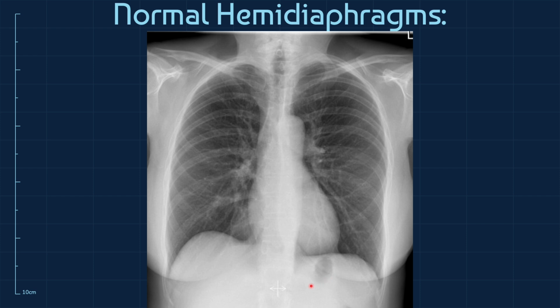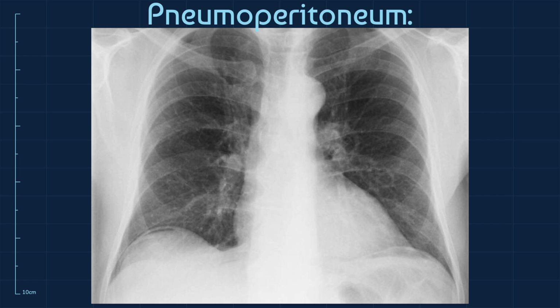air, and it's known as the gastric bubble. It's just some air in the stomach found right under the left hemidiaphragm, and it's considered a normal finding. Now, a common reason we look at the hemidiaphragms is to determine whether there are any pathologies or not. And even though we're looking at a chest x-ray, there might be some abdominal pathologies that we can find from a patient who took an erect PA radiograph. And in this case, it would be finding some air right under the diaphragm.